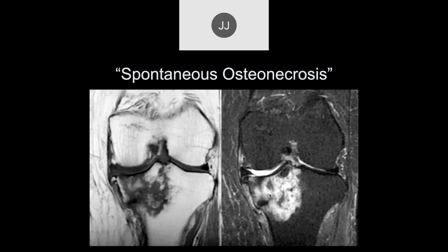So, yeah, a fracture of the metaphysis with some depression. If you notice on the margin there in the tibia, there's a buckling present right there, and that's an obvious compression.